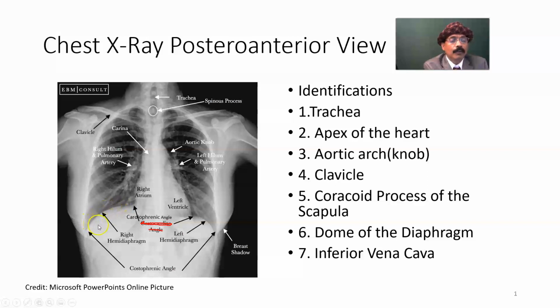Okay, we got that. And here is the site for the inferior vena cava opening into the right atrium, and here is the site for the opening of the superior vena cava. The superior vena cava receives the azygous vein, not shown here.